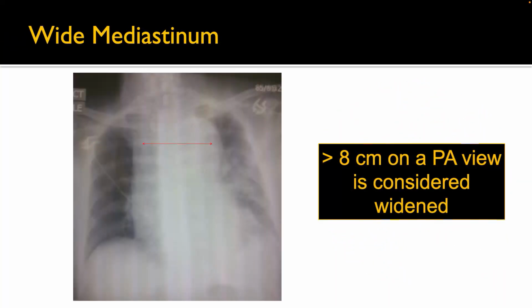Mediastinum. The traditional teaching is greater than 8 centimeters, and that's on a PA. But if it just looks wide from that standpoint, you have this nice wide mediastinum, there's something bad going on there.